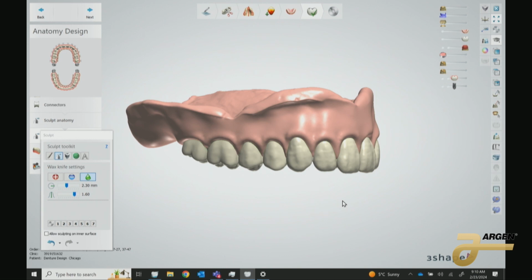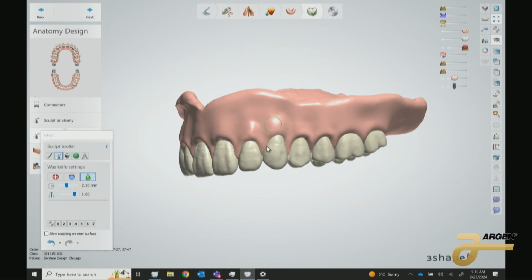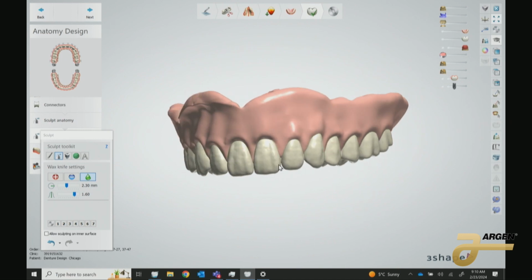They're all part of our tooth. So I did edit them a little bit. So this one here you can see is following our tooth, and make sure everything's nice and clean. This is a standard, everyday, normal denture. We don't need to go over the top with characterizing.